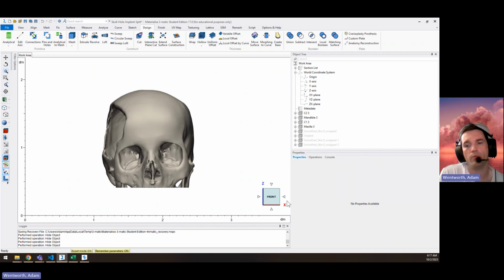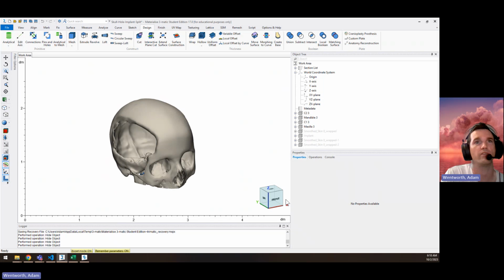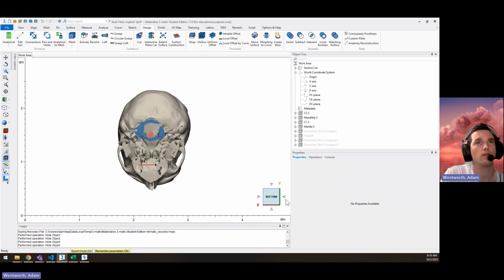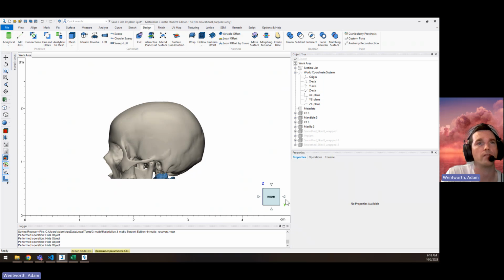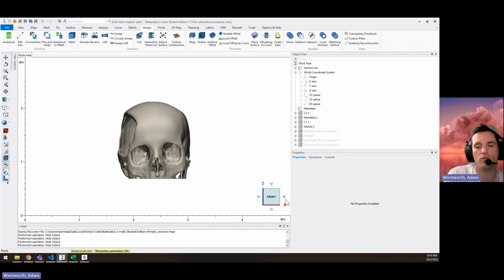And it would be great to use the number pad on the keyboard to snap to specific views, like an axial view or a sagittal view. Just by hitting the numpad keys, you could get those views really quickly and make sure that you have the same view every time. So a surgeon who's used to looking at things on the screen really wants them squared up to, let's say, a perfect coronal view.